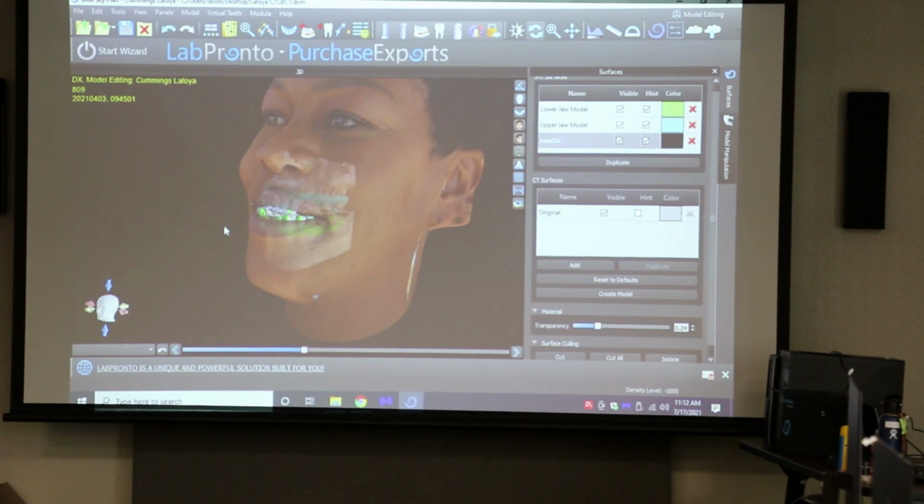That's awesome. Yeah, you can see it's a little bit off. Even if you're doing crowns, like 5 to 12, this feature is so nice because your midlines are going to be on the left. Let's change your model to the head 3D. And now you can actually just drag the head. I'm just looking for the head. So you can use the rings, the arrows, or manually drag the whole thing.